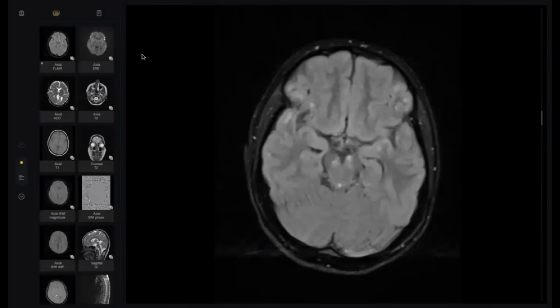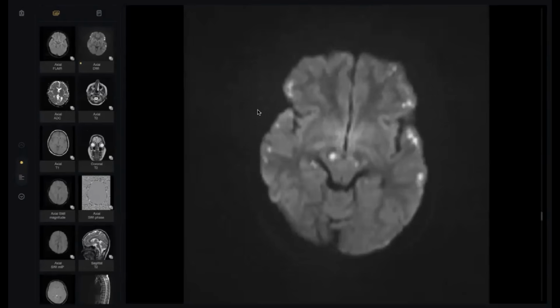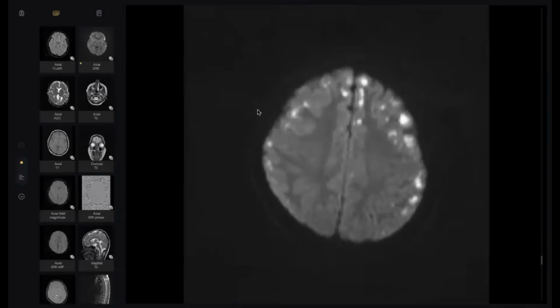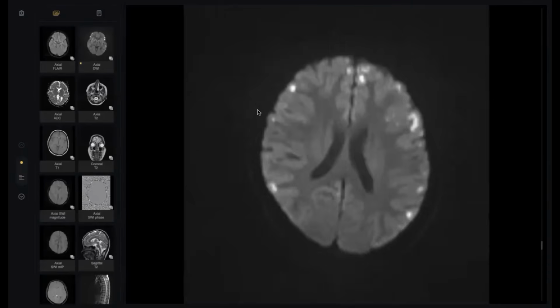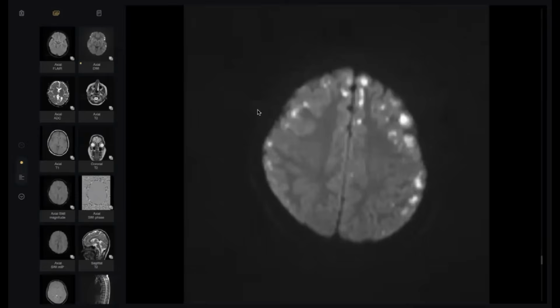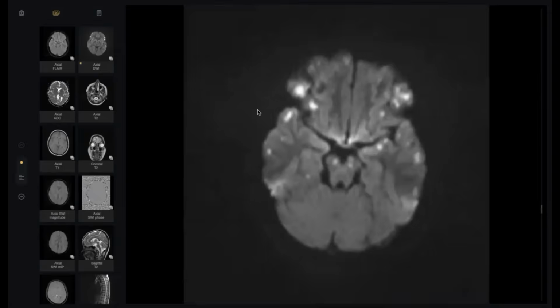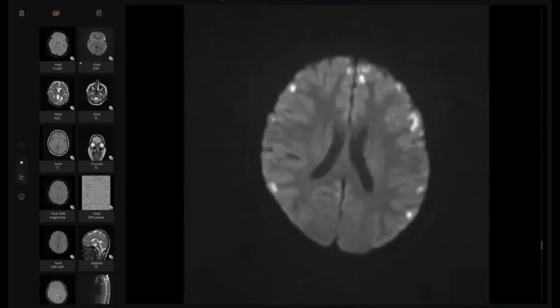When you find multiple small infarctions, either randomly distributed or symmetrically distributed in the brain, think of vasculitis. This vasculopathy is a type of vasculitis. My colleagues, if somebody told me, doctor, it is a vasculitis, it may be acceptable. Thank you so much.